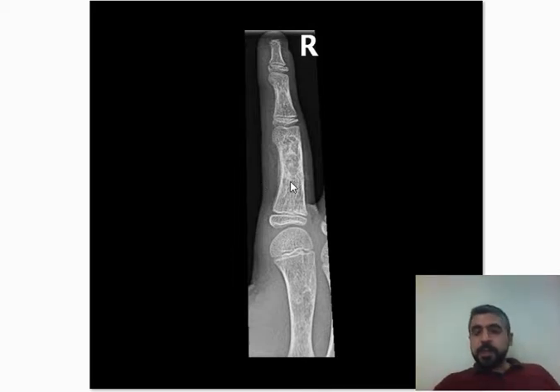On MRI images, enchondroma can present with the usual cartilaginous tumor appearance. That is, it is hypo to isointense on T1 weighted images and hyperintense on T2 weighted images. Calcification might be seen as small tiny dots of hypointensity if present. Usually it is not surrounded by bone marrow edema unless there is a pathological fracture or some sort of malignant transformation, and contrast enhancement can be variable.